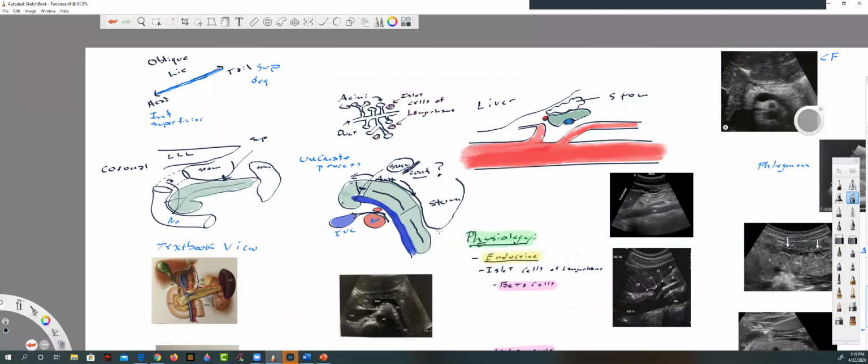Oh, it's anterior to the vein. Some books will say the tail is anterior to the vein. Well, but look at this configuration, guys. A lot of books don't say that the tail is anterior to the vein. Look down here. The tail's not really anterior to the vein. The tail is lateral to the vein. If this is the vein, anything off to the side is lateral.